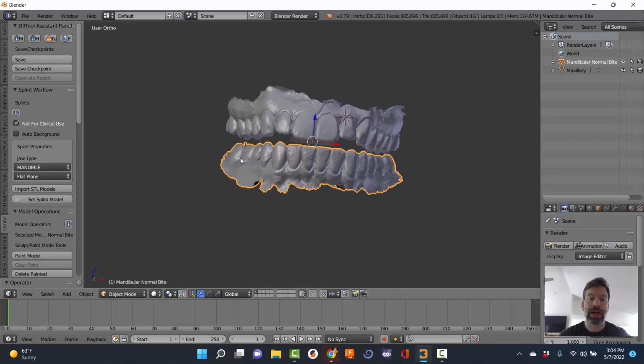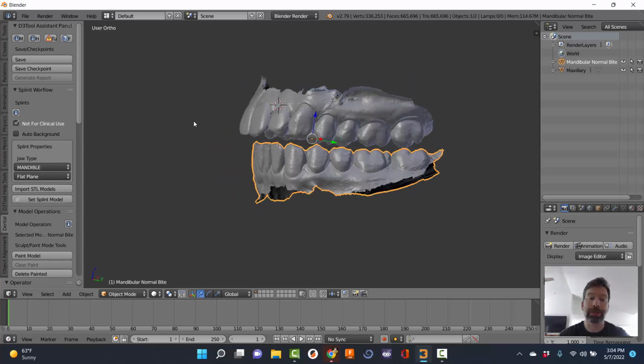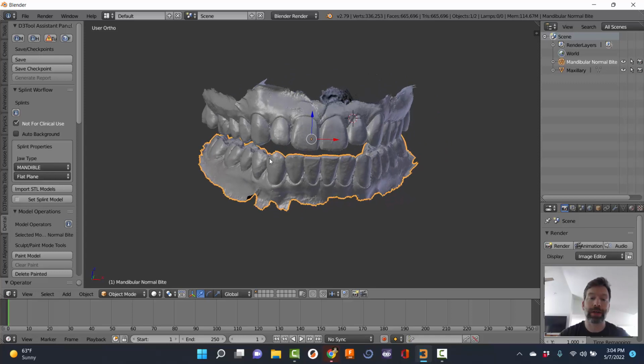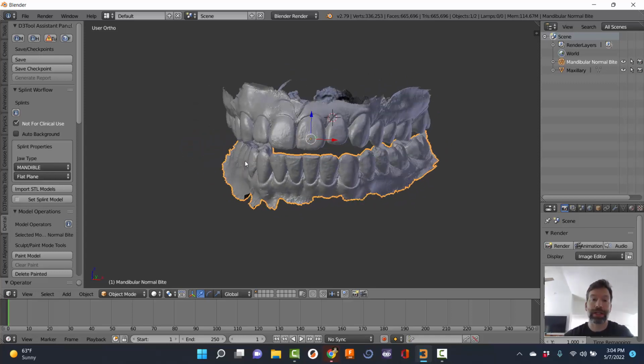If you don't have a wheel, if you're not using a traditional mouse like that, I honestly don't know what the replacement is for those. So you'll have to figure it out on your own. Yeah, or just get a $9, $7 USB mouse from Amazon.